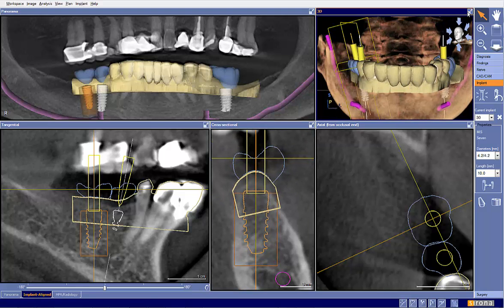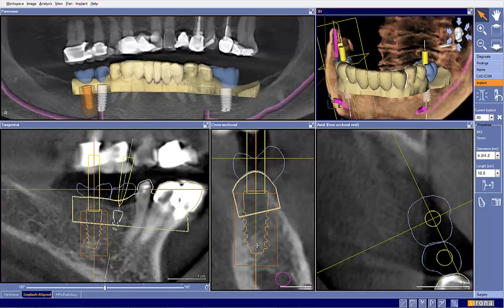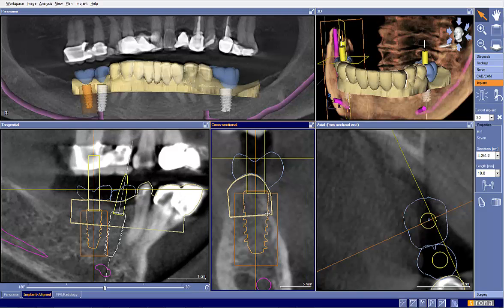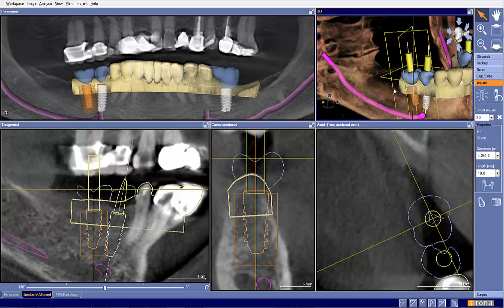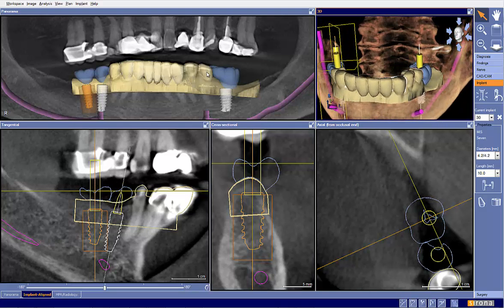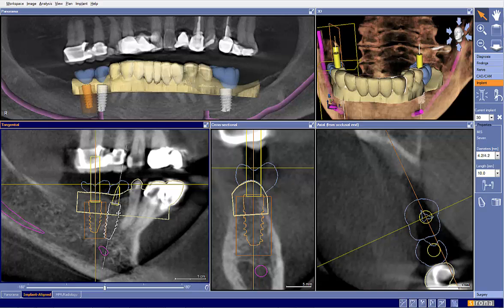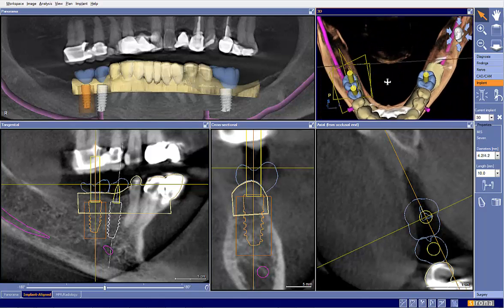And here, as I look down the line, you can definitely tell how that is tilted out there. So, and we can see why. So let's go ahead and bring that in and bring that to a more ideal position, like so. Now again, this is outside of the bone certainly, but something that can certainly be managed with just a little bit of grafting at the time of placement. Now, some may not like to place this implant at this angle compared to that tooth, so if that were the situation and you wanted to be a little bit more angled, certainly I would accept that as long as I can try to get my screw access into the center there.